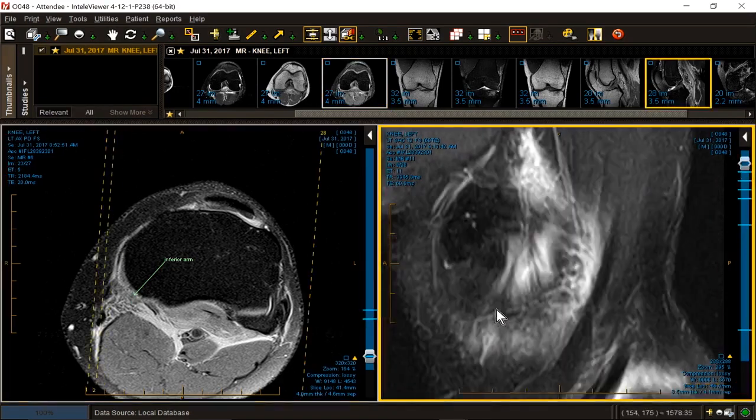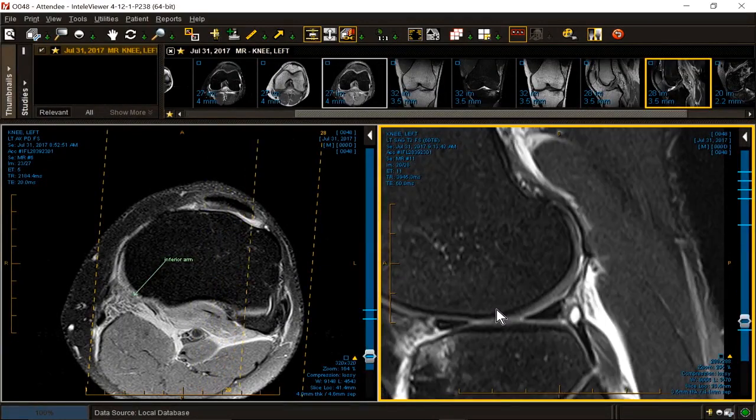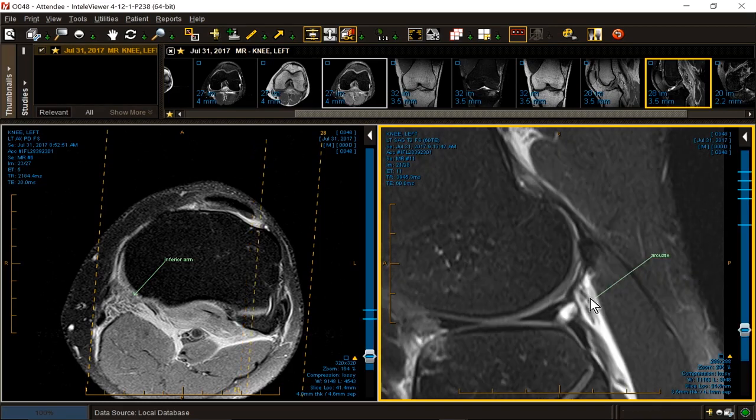So now let's go over to the lateral side. This patient did not have a lot of lateral pathology. Mostly the pathology was located in the arcuate. One of your colleagues was asking me about the wave sign. I've not used that term, but you know, when the arcuate tears like any ligament, it's wavy. So you could use that sign. But these irregular, fibrillated, striated appearing structures that are non-continuous represent areas of arcuate injury or tear.